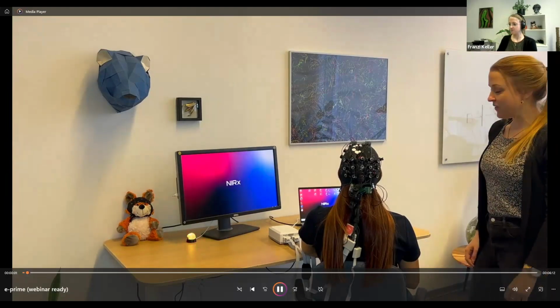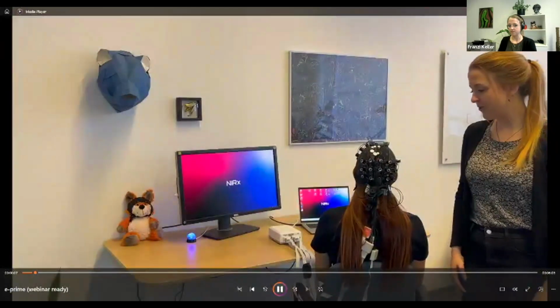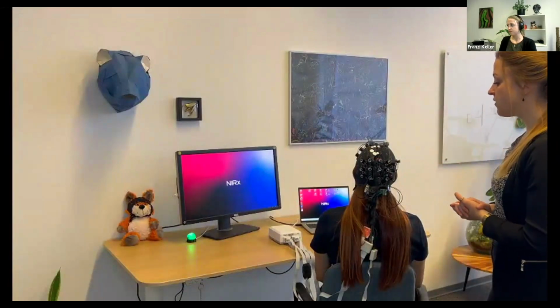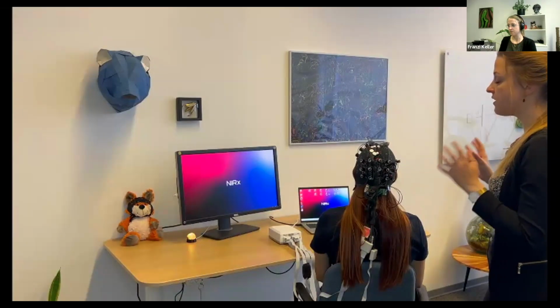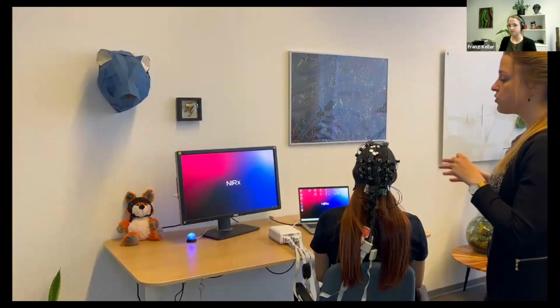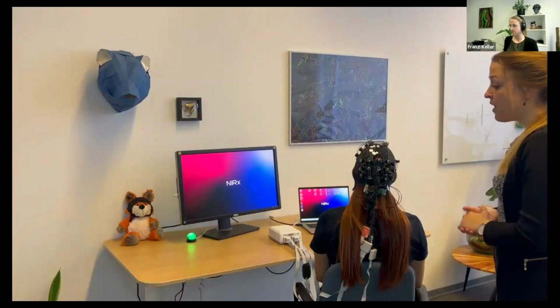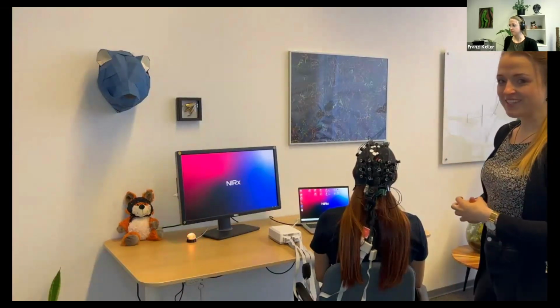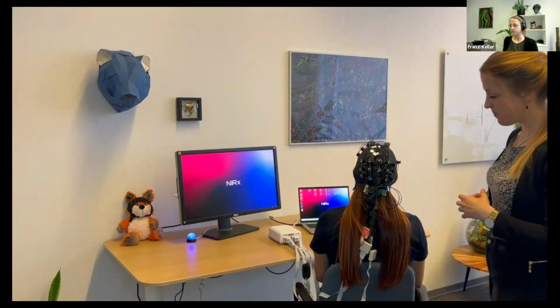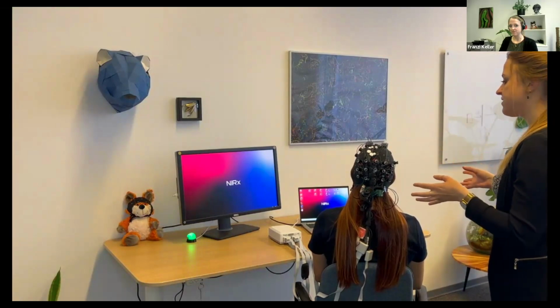Hi everyone, and welcome to this last part of the webinar. So I'm going to show you now what we heard in theory in practice. So the goal of this video is to show you the full integration of the NIRx extension for ePrime in an experimental setup, meaning I'm going to show you how to start up the software, do the signal optimization, and do the data recording. For today, to show you something different than our usual finger tapping paradigm, we have chosen a visual checkerboard experiment that is pre-programmed in ePrime. Accordingly, we have our setup here prepared.